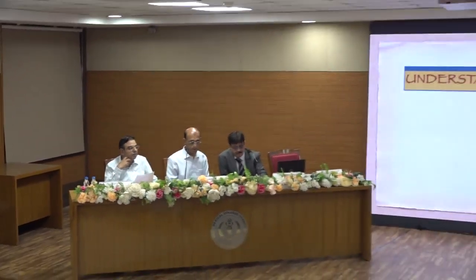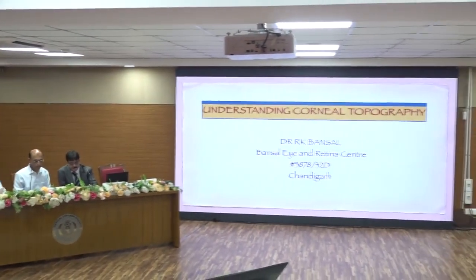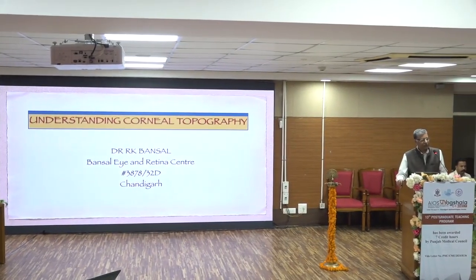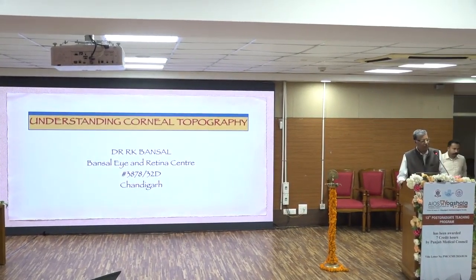Basically, my topic was mainly for the residents that whenever they get a chance to see topographic graphs, there are certain basic things which they need to understand before they can go on to the diagnosis of this topography.